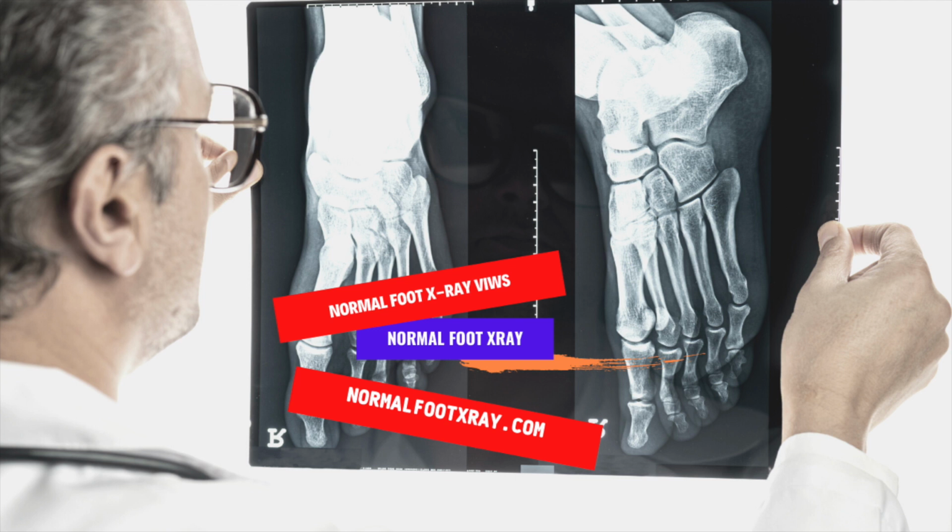There are 3 types of normal foot X-ray views: oblique, medial lateral, and anteroposterior. Whenever possible, an X-ray should be taken when the foot is in weight-bearing. An X-ray should show all bones and joints, including floaty bits, which are likely accessory ossicles. Small avulsions are often missed.